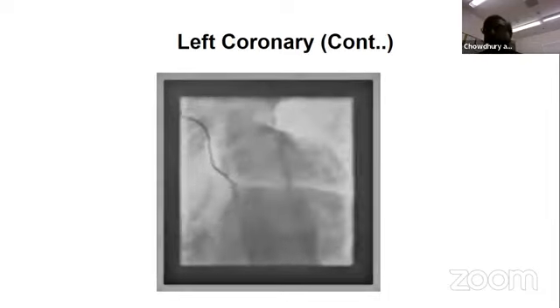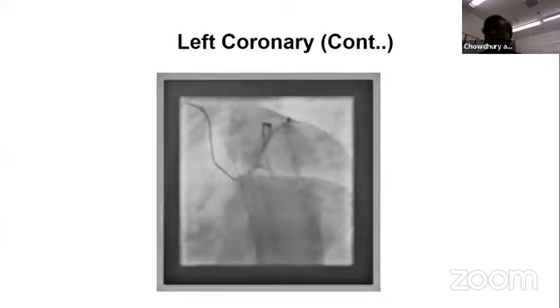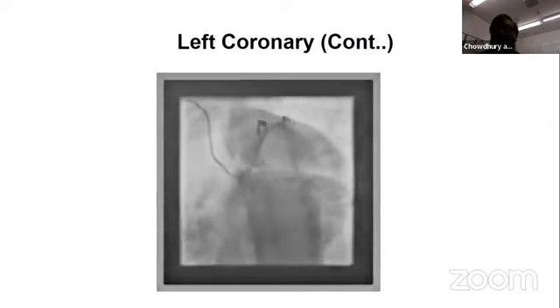And there, as pointed out, the LV recovery is much higher than the infarcted LV. We don't normally do cardiac MR, but you can see gadolinium enhanced MR, seeing the extent of the MI.